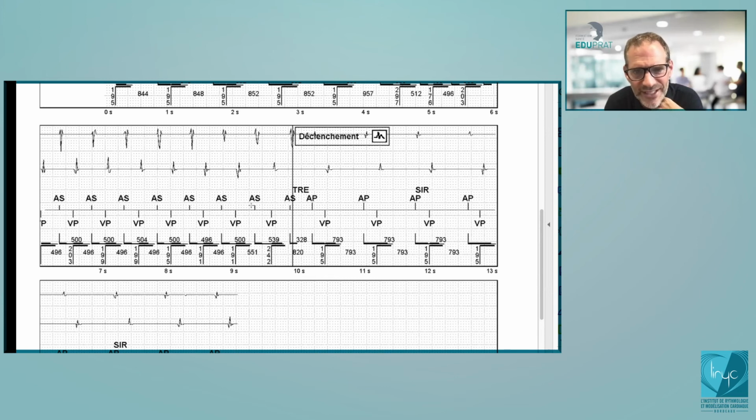If it's a sinus tachycardia, if you prolong the AV delay, you will not change the atrial cycle. It will remain exactly the same. So this is a proof that this is a PMT. Here it will be written PMT in American tracing, here it's going to be written trigger, and then interruption, no tracking of this atrial sensing with ventricular pacing. And then after 330 milliseconds, AP, VP, end of the tachycardia. So it was clearly a PMT.